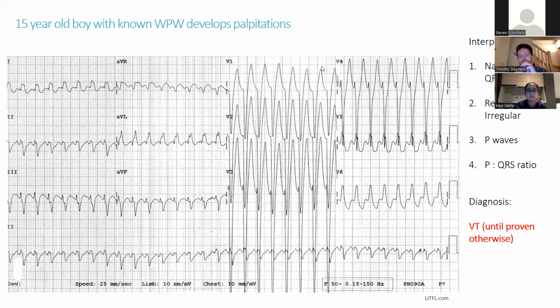Cardioversion, yeah, that's right. That's your safest option here. And you're right, somebody's talked about fusion beats or capture beats. Good, you obviously know, looking at your aVR, you'd be looking at your algorithm for VT. So well done. But in a chance situation, you're basically going to give some sedation to this patient if required, or potentially intubate if needed, and shock them out of it. That's the safest thing you're going to do here.